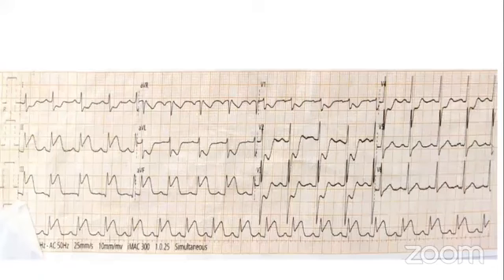Because you raised your hand on the previous ECG. Hira Boni. If Hira Boni is not willing to answer this, okay, Naim Hassan, please try to answer the ECG.